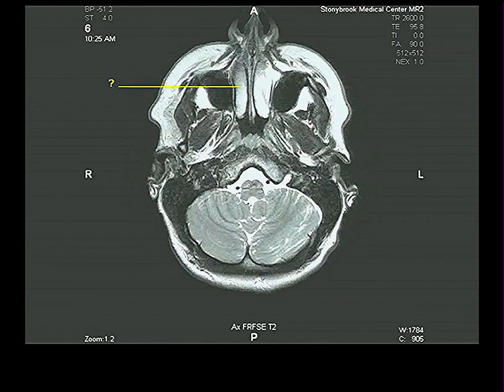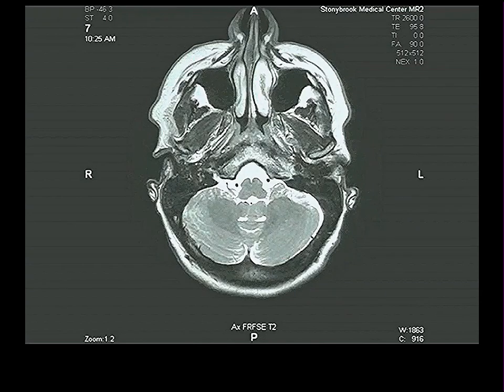How about this thing? A big longitudinal structure. Yeah, the inferior concha. Right, very good. Here's the nasal septum. Here's the nasopharynx. A little hard to see the torus tubarius at this section. Maybe it's not so bulgy yet. But these are the inferior nasal conchae on either side. There's one. Coming up again, nice inferior nasal conchae. Now we see the torus tubarius on this side right there, and we see the torus tubarius on that side right there. So here's the fossa of Rosenmuller there, fossa of Rosenmuller there.